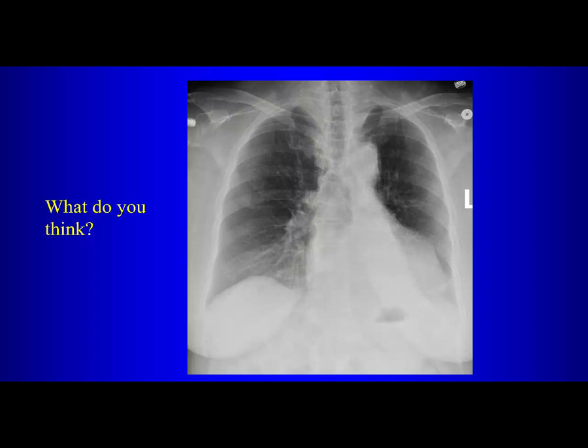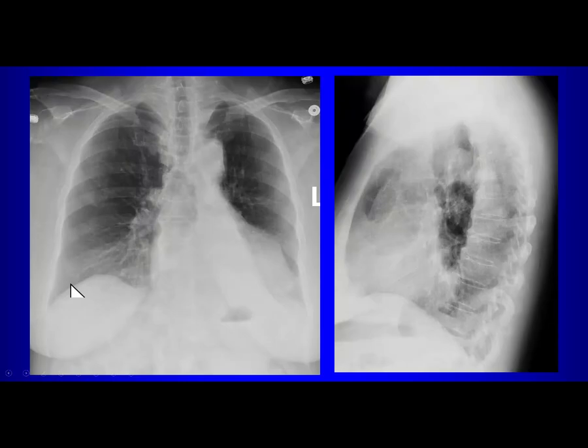Do you see the left diaphragm? No. No, we don't see the left diaphragm. The left diaphragm is silhouetted here. Okay? What else? Left interlobar pulmonary artery is somewhat obscured. We don't see it very well. Okay, but this is characteristic. This triangular shape behind the heart border that obscures the diaphragm is the characteristic appearance of left lower lobe atelectasis.